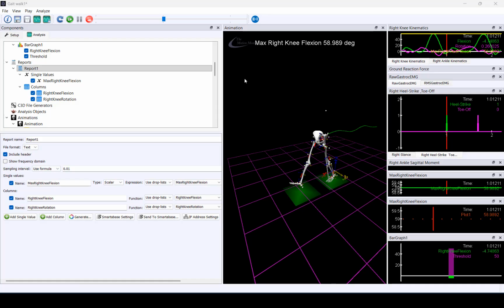This becomes more important when recording data, so it may be helpful to note that analyses can always be applied after data collection. Some items are found within the Setup node, but are actually saved within an analysis because they are likely to be changed after data collection. These include hardware filters such as Butterworth, Chebyshev, Fast Fourier transformation, high, low pass, and notch filters, gap repair, force plate thresholds, subject-related data such as maximum foot to GRF distance and foot to force plate assignment method, and anthropometric data.